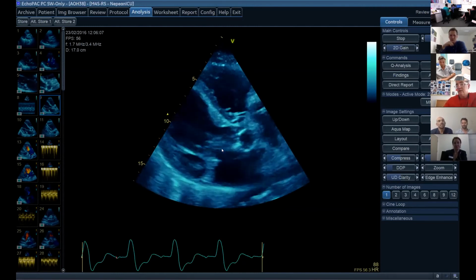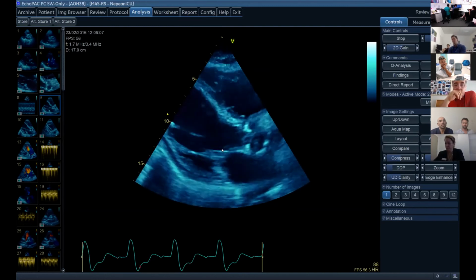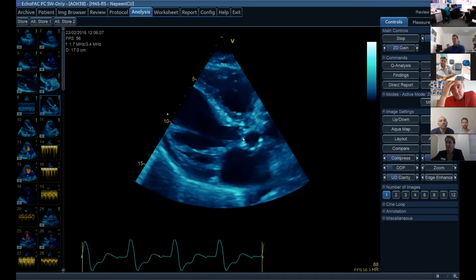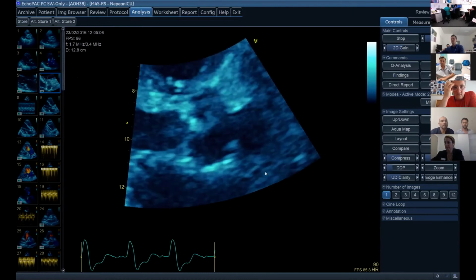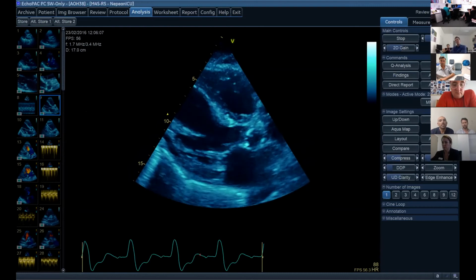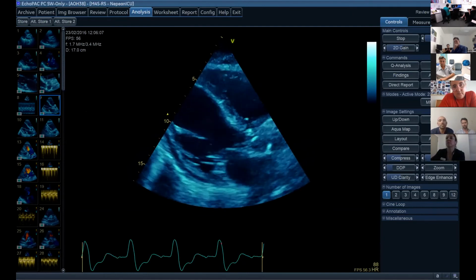Lewis, let's have a go down this one for me, and tell me what you think about this picture. Yes, it's parasternal long axis. The major finding is the aortic valve. Once again, there is evidence of calcification with poor leaflet opening. Sorry, off axis on the first one. The LV walls are thin and contractility seems reduced.